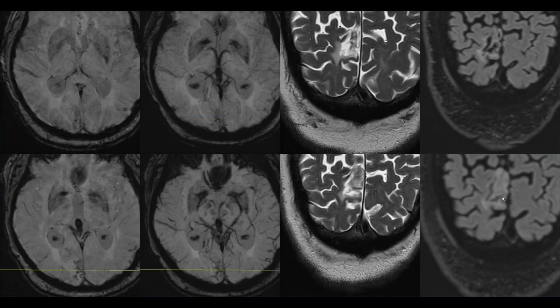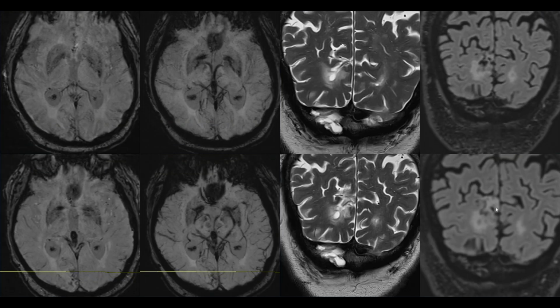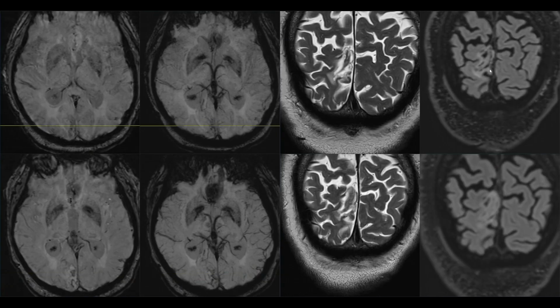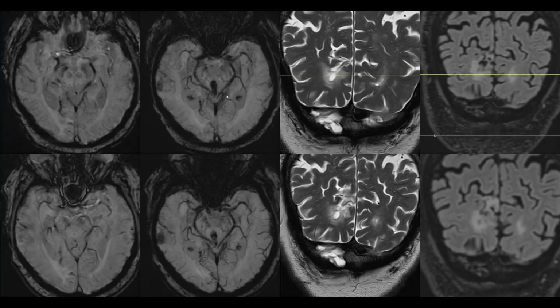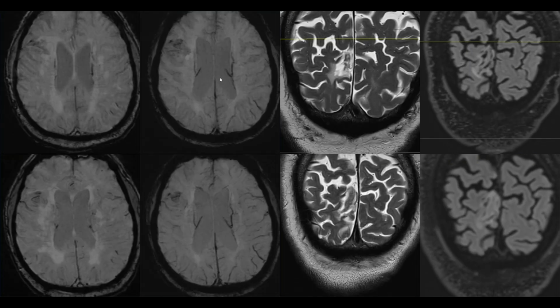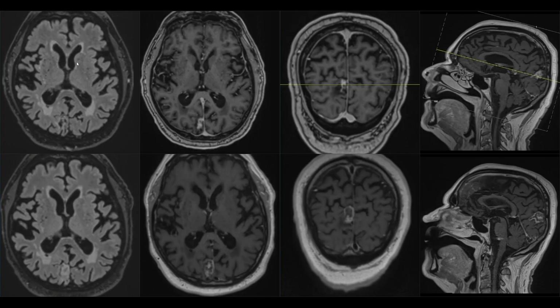As well, we can appreciate the detailed anatomy on those zoomed in coronal FLAIR sequences, where you can see some tissue left with edema and now tissue loss in the same area. So doctors asked if there are signs of cerebral amyloid angiopathy, but we don't see any other hemorrhages.